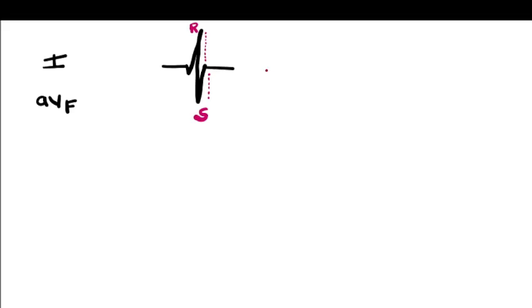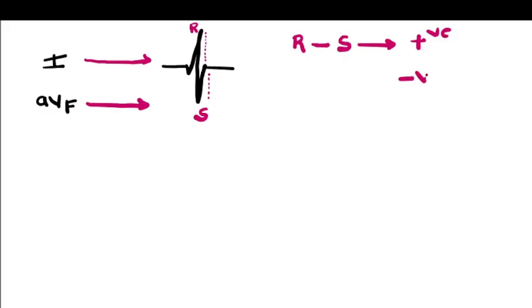So what we are going to do is look at the QRS complex in lead 1 as well as in aVF, and subtract the depth of S from the length of R. Then we will see whether the value is positive or negative.